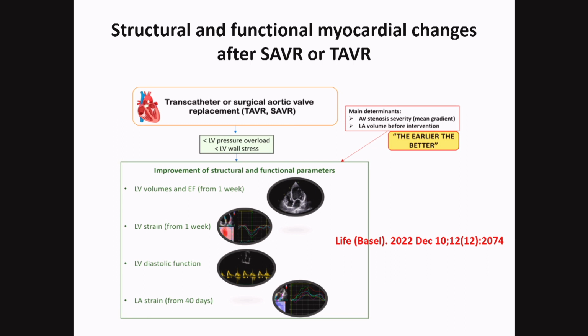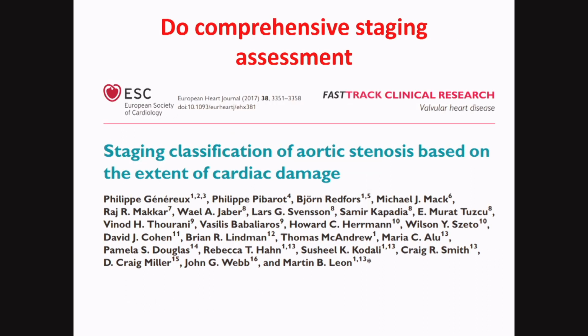The left ventricle diastolic function improves, and the left atrial strain is a little bit more delayed, up to 40 days before it shows its improvement. Now, one other important point is the staging of the severity of aortic stenosis. We look at aortic stenosis and we sometimes forget about its sequelae.